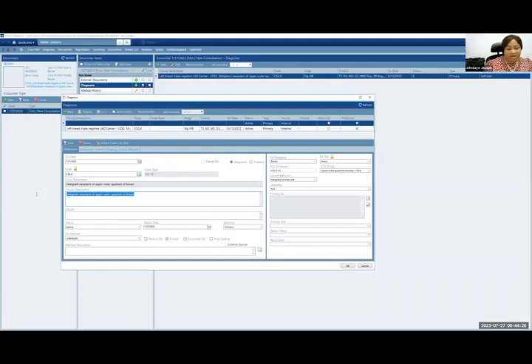And now my clinical description is going to be metastatic left triple negative breast cancer. Because again, let's say we confirmed it and she was HER2 negative. So metastatic triple negative breast cancer, diagnosis date will be the date that is on that report, which we're using now to say she's diagnostic, she's metastatic. So, and how did we confirm the metastasis? We would say that it was done on imaging.